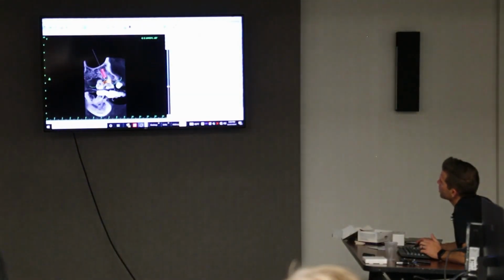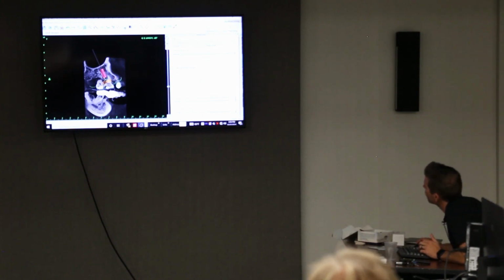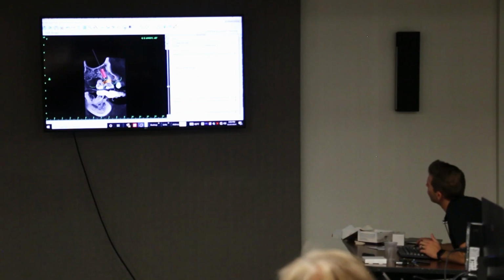One of the things I want to point out is, do you see this green outline here? Can you guys see that? That green outline is called the outline or the hint, and that's an outline of my model. Now, see on the right, see how it says hints?